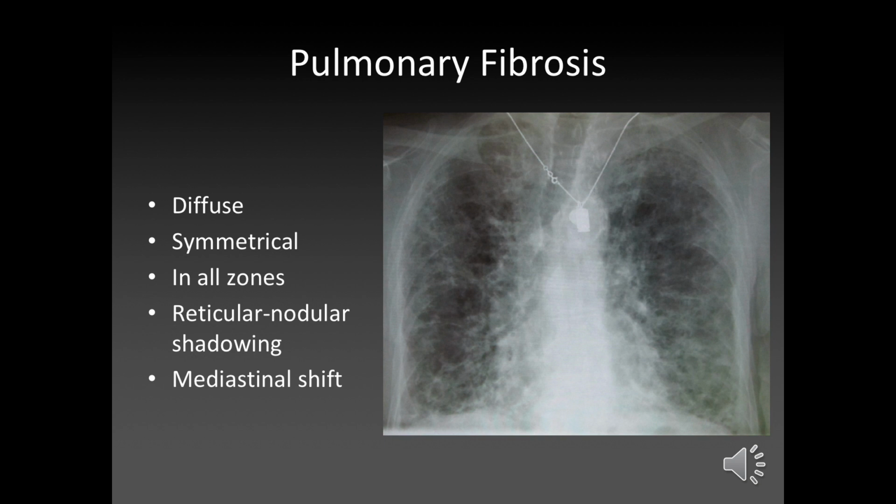Patient's wearing some kind of necklace as well, which you should comment on, really. If you're in an exam and you see this and you get away without mentioning this, you should really be making some kind of comment on it.